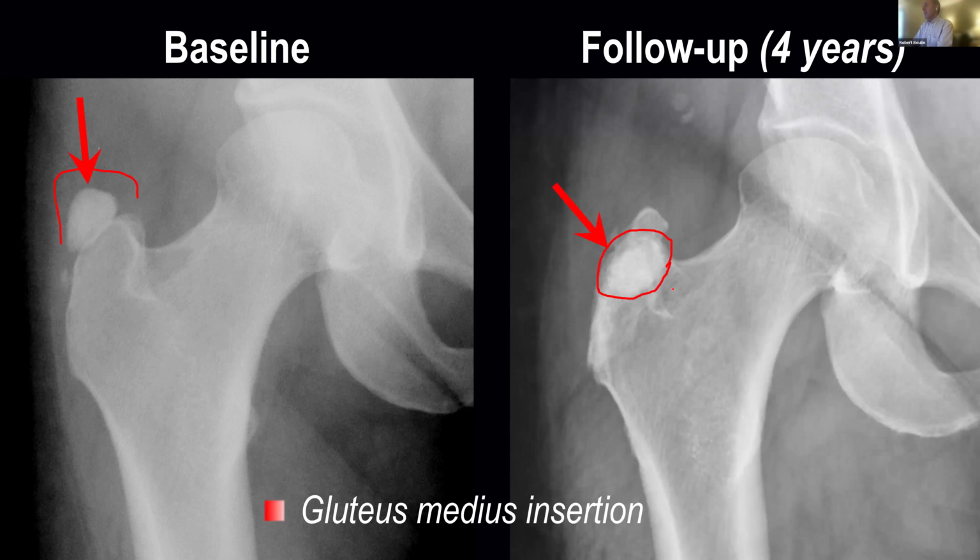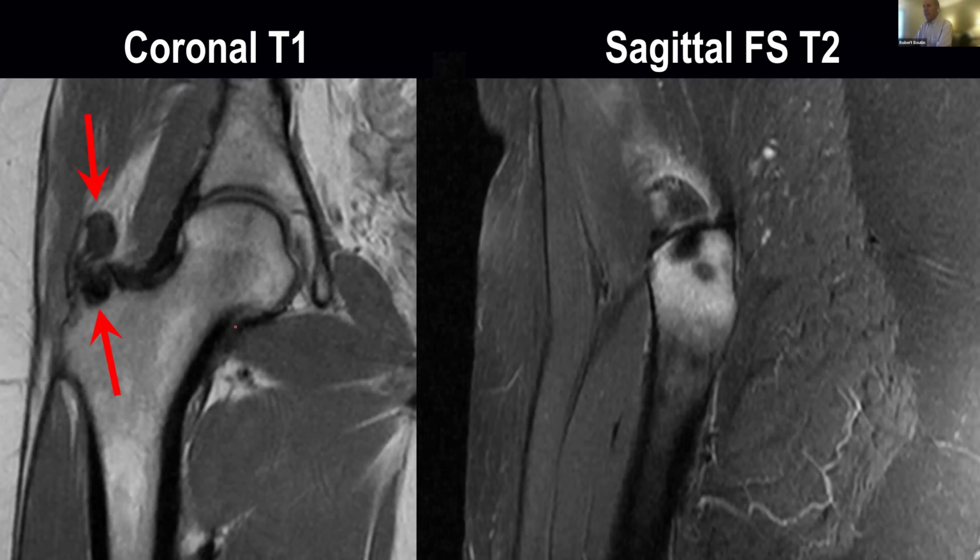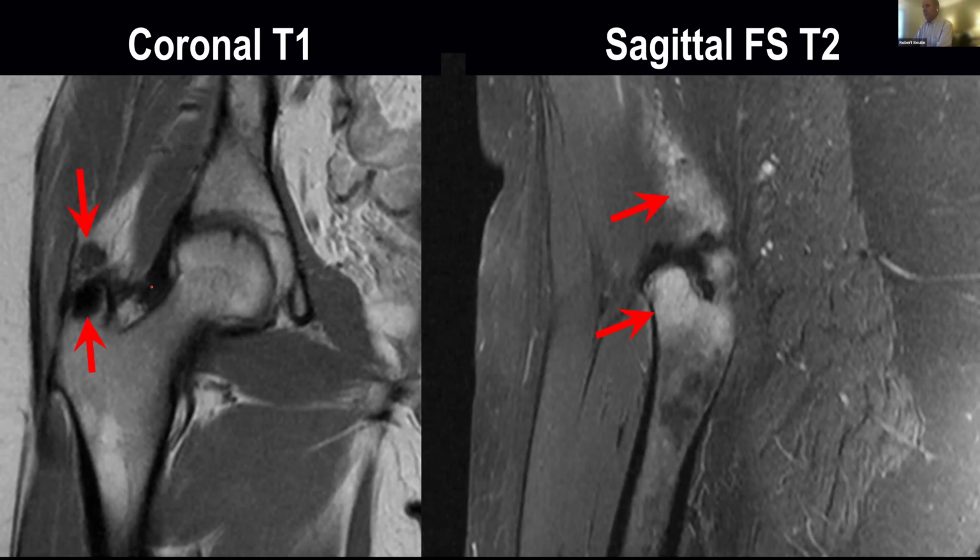And we see that in different places like the shoulder, but also in the hip. And when that occurs, it incites a bunch of bone edema in the adjacent bone. So just be aware that this, if you haven't seen it before, can sort of be a confusing appearance, but this is the way calcific tendonitis looks, whether it's in the shoulder with the rotator cuff or in the so-called rotator cuff of the hip, the abductor tendons like the gluteus medius and minimus.